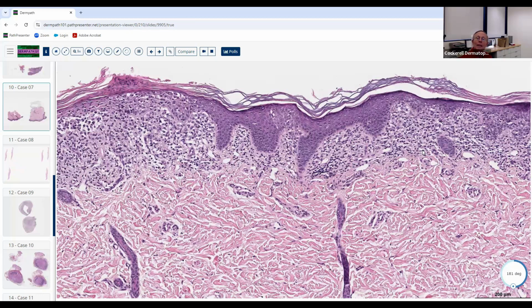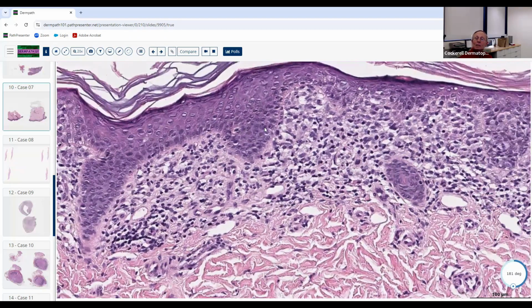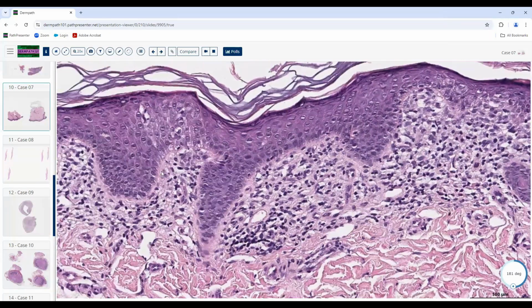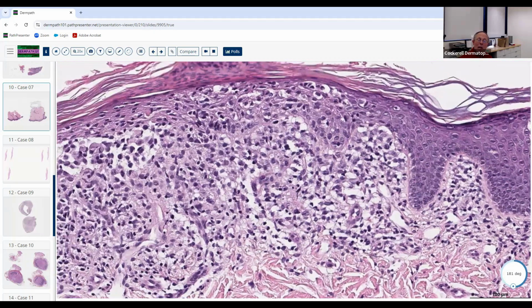It's relatively short. Now let's look at a little higher magnification. Do we think these really are histiocytes here? Could they be plasma cells? They have a lot of cytoplasm, way more than lymphocytes. So what's the differential diagnosis between histiocytes and other cells that look a lot like histiocytes because they have a lot of cytoplasm, of lymphohistiocytic origin?